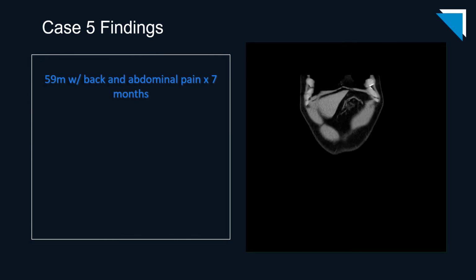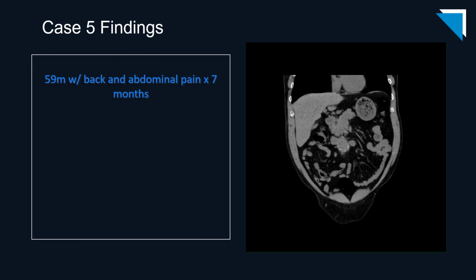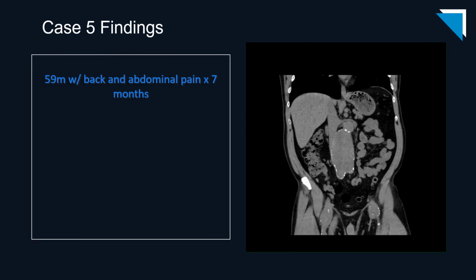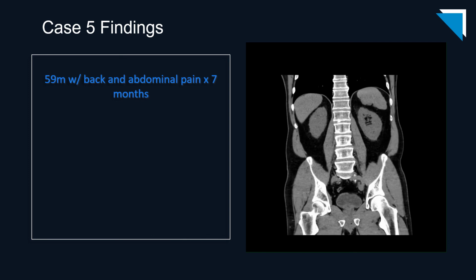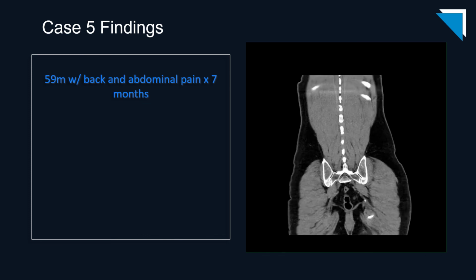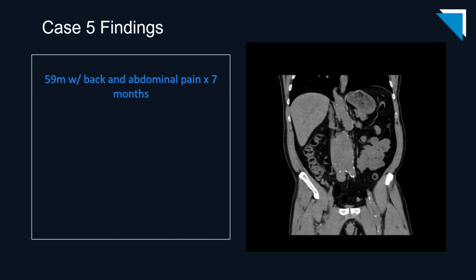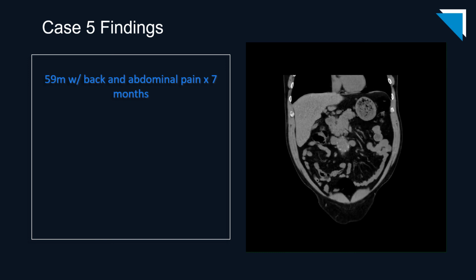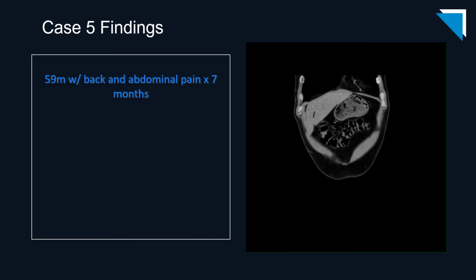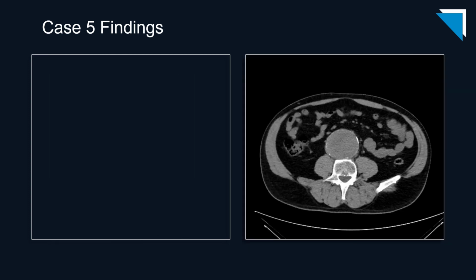Here are the coronal images from the same patient. Let's briefly review our findings.